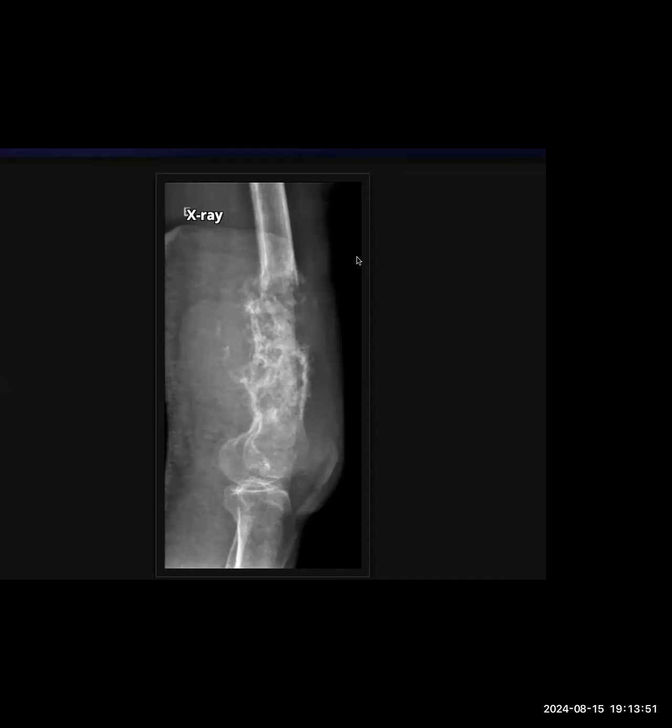So this was a very classic case. You described the lesion well, and this was a case of osteosarcoma. So when you say it's skeletally mature, avoid using Ewing's. Again, the site is metaphyseal, right? So I would say stick to osteo, and oftentimes when you describe, say it as an aggressive bone lesion. Don't commit to osteosarcoma right away.